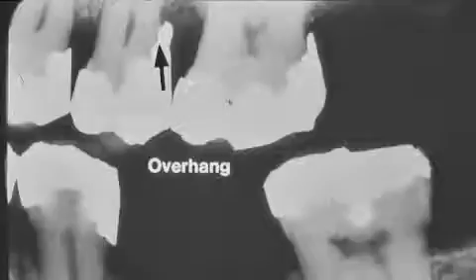The arrow indicates an overhanging restoration, an amalgam restoration. These overhangs are too large to remove with instruments, and probably the tooth would need to be crowned. We see the overhang on the distal of this tooth 13, also on 12, distal of 14, and distal of 21. Notice that apical to the overhang that the arrow points to on 13, there is a cratering of bone above the restoration. Is there a better type of X-ray that would show the bone loss on this slide?